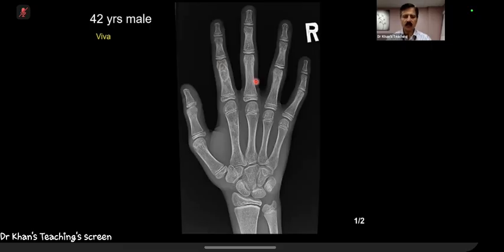Langerhans cell histiocytosis, considering the age, so many things can be considered. But the key finding here was that chondroid matrix. So this is an enchondroma with chondroid matrix, which is punctate calcification. So the take-home point is that that has made the whole of the differentiation.